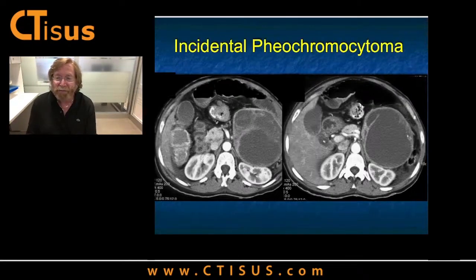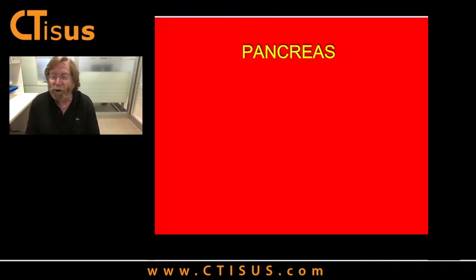Well, this was a pheochromocytoma. Pheo is a chameleon, can look like anything, big or small, vascular or hypovascular, solid or cystic. This was cystic. This was a cystic pheochromocytoma. What a great case. Well, I got some more stuff because I don't want to only leave you with adrenal. Maybe I should do that, have a quiz, pick a topic and just stick with it.